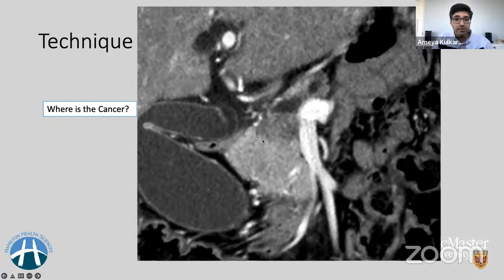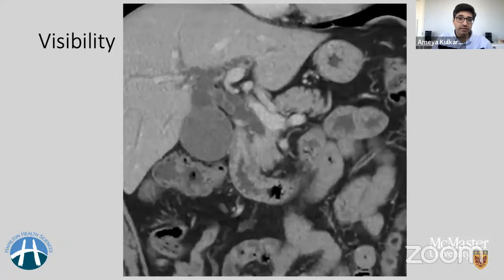But that image is just to show you what is the importance of doing pancreatic parenchymal phase in detecting these tumors. Unfortunately, it's not as easy as this case looks like. Sometimes you get a cancer which is like this. So even though this is a portal venous phase, unfortunately, this was the only plane in which I could reconstruct it properly. All you will see is just dilatation of the CBD and dilatation of the pancreatic duct, something which you call the double duct sign. And then you don't see a mass no matter how hard you try.